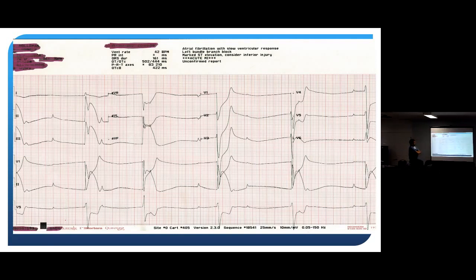Way too slow. But what do you think is going on? Drugs, electrolytes, or ischemia? Well, he had a normal EKG 20 minutes earlier, and now I've got ST elevation in 2 and 3. He's having a big STEMI. Remember, right-sided infarcts would make you slow. I'd also argue that he's probably in heart block, right? But I'm still going to manage him the same way.